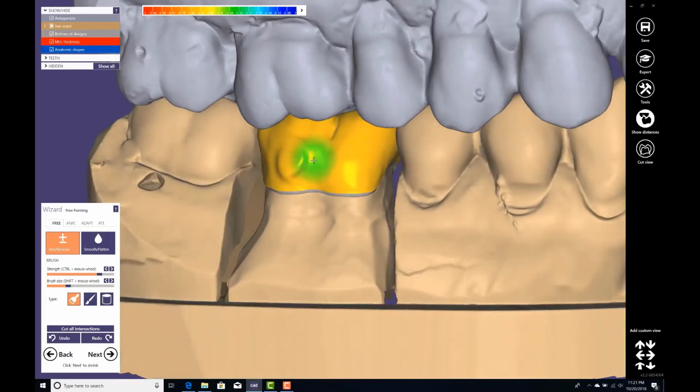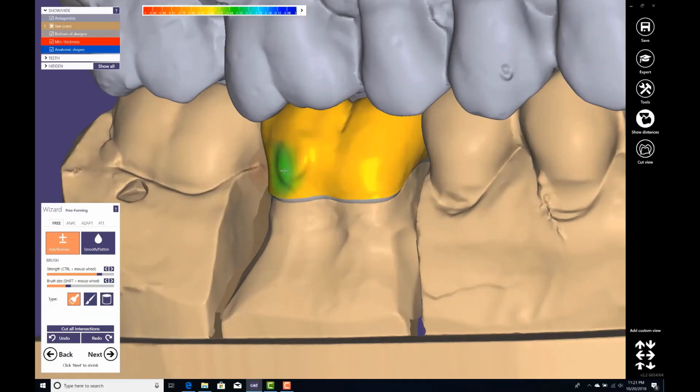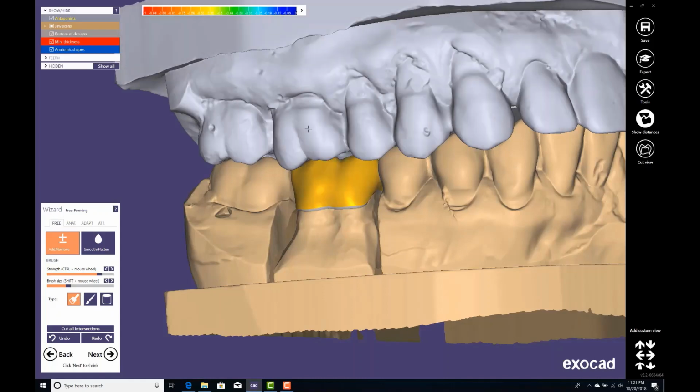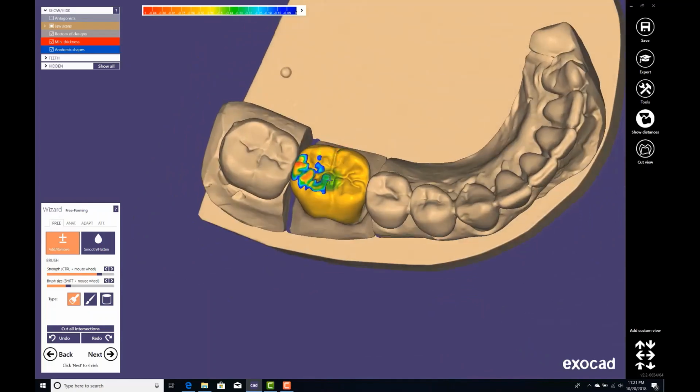But let's say that now I want to smooth, because I don't like this little bubble I have here. By clicking control and shift, my brush right now becomes purple. So control shift and left, and right now I'm smoothing. It's a pretty good tool which I suggest you use, because it makes your design life much easier and faster. You can have a really good workflow.